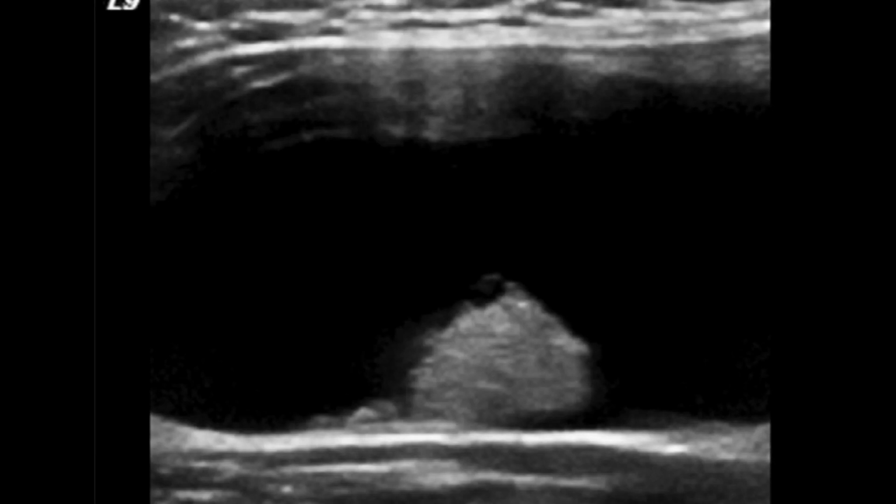This is the same U5 malignant nodule. This is a complex nodule. It would be considered complex because whenever there is something within the lumen, this would no longer be a simple cyst, it would be called a complex cyst. Within the cyst you can appreciate a soft tissue nodule, and this soft tissue nodule has vascularity on the Doppler imaging. So this is a malignant nodule.